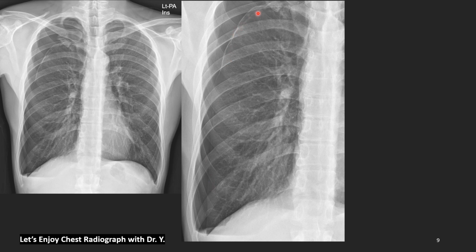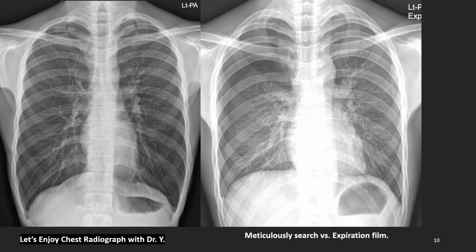And several bullae here. What do we see in the left side film? Looking normal? Something wrong? I don't know. But if you see the film on the right side, it is evident that this is pneumothorax. Large amount of pneumothorax in the upper portion with the lobar anatomy here.